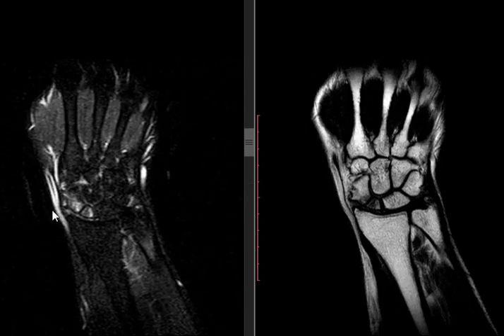They are both highlighted, indicating that this part is still not dead, there is edema. So the whole purpose of the image is to see whether we do screwing to increase the blood supply to the proximal fragment, or it's dead, game over.